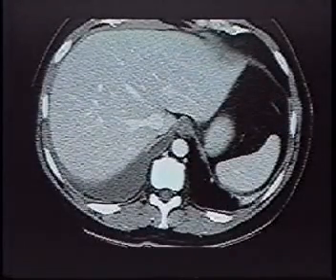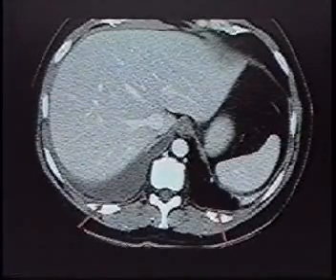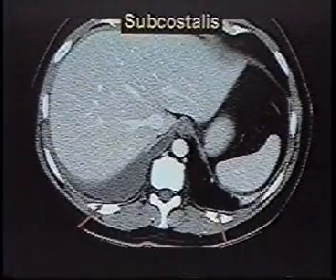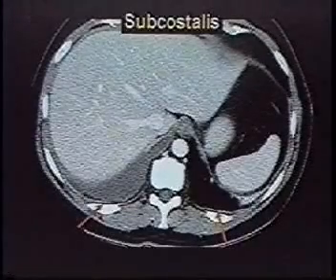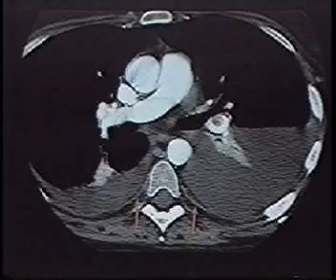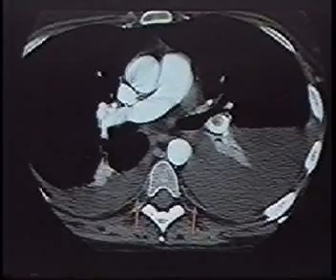Posteriorly, at approximately the same level, thin and symmetrical soft tissue muscle strips can also be seen sometimes just inside of the ribs. And this is a normal structure seen in a minority of the patient population called the subcostal muscle. Intercostal vasculature travels along the paravertebral regions and can therefore sometimes mimic pleural thickening, and this can be easily differentiated by looking at contiguous images.